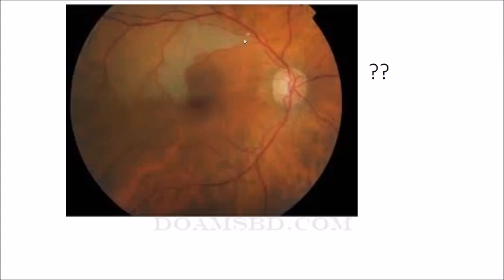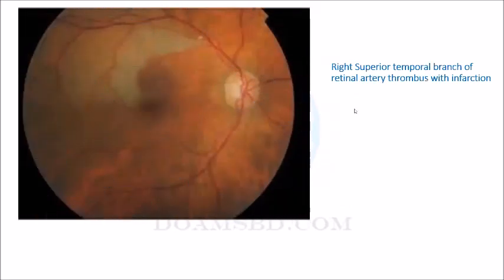So this is a white spot. This is thrombus. It is also vascular occlusion. Right superior temporal branch of the retinal artery thrombus with infarction. So this white area is infarction. So we must be oriented with many different appearances of the retina.